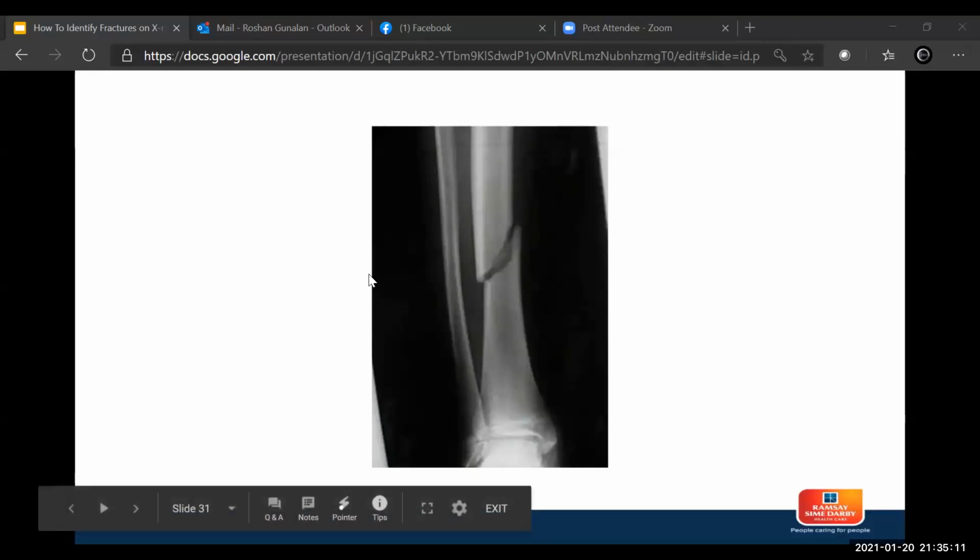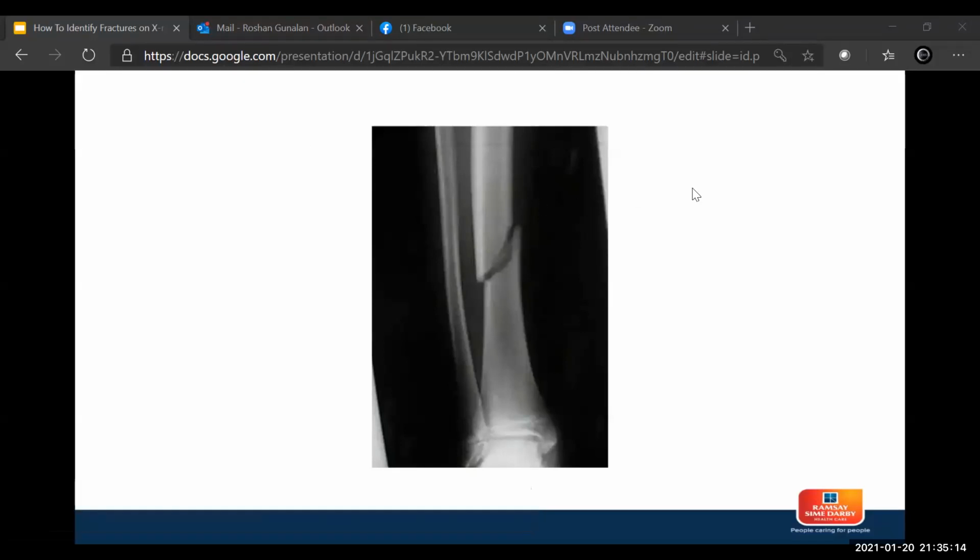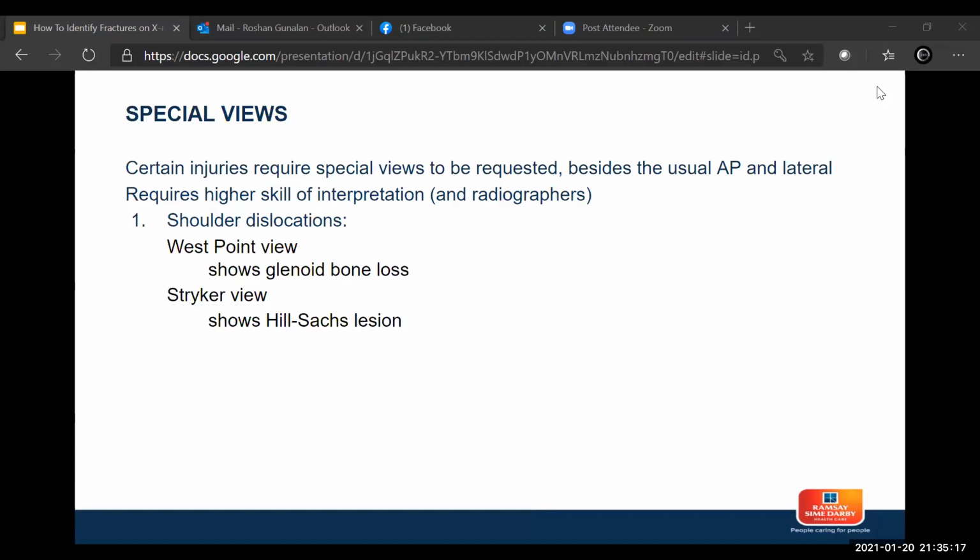There's a slight bend in that as well. Well, okay, done. All right, I think now, okay. All right, we're done with the examples.